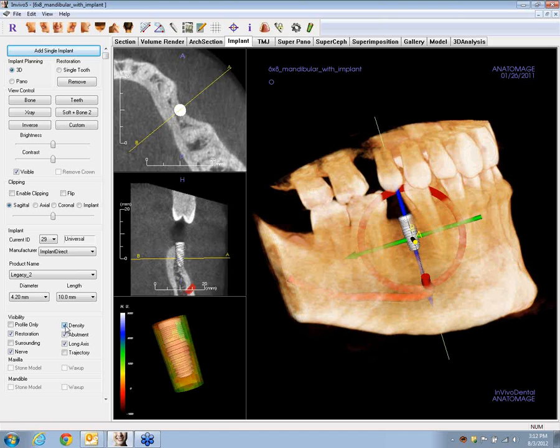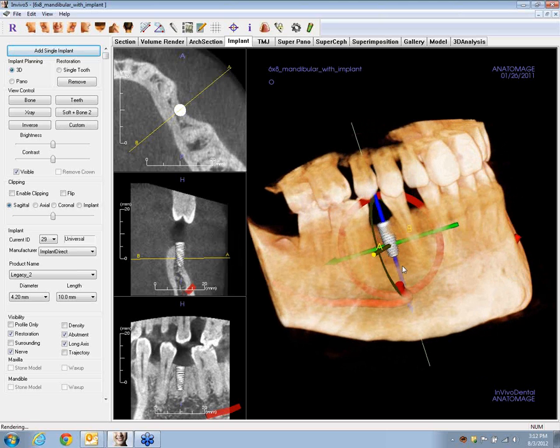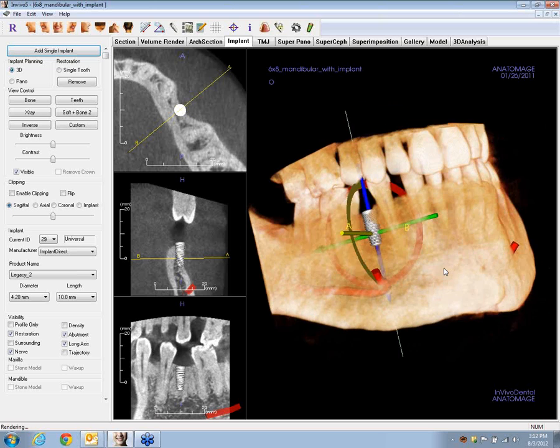If you uncheck it, that density goes away, and it gives us another perpendicular view to this one to let us know how we're doing angle-wise. All right, key to taking a look at this two-dimensional look here is to notice this A and B flag. The A and B flag is shown right on the implant. You can see A and B are clearly labeled here, so that in 3 dimensions you get a kind of a lay of the land.